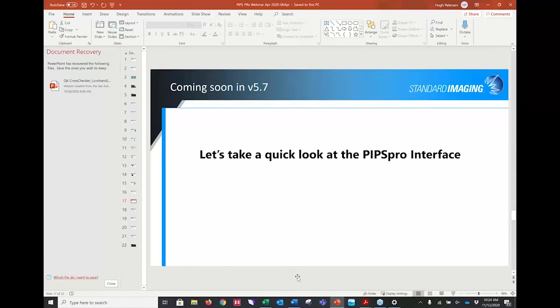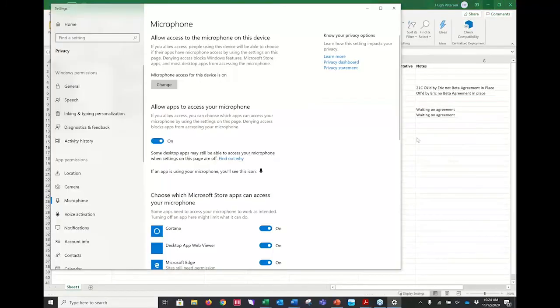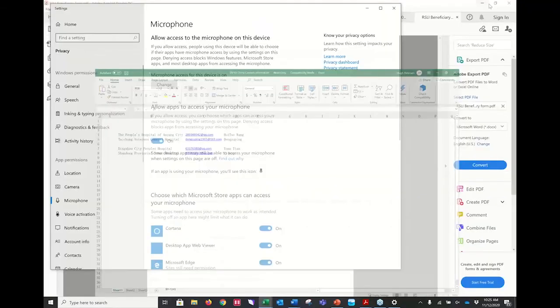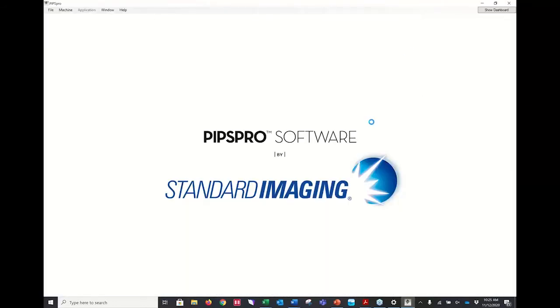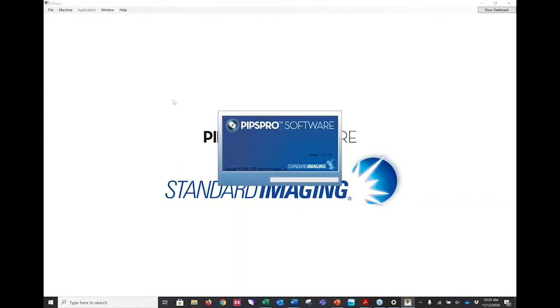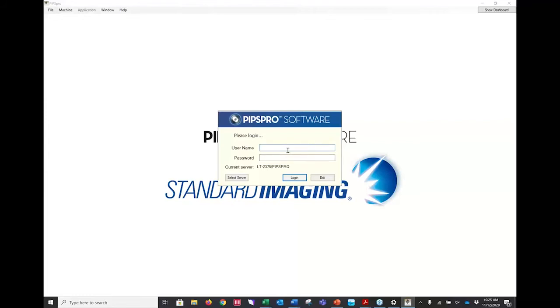Apologies there. Not sure exactly what happened with that. Bear with me one second. This is a beta software for our next release, so it's not quite finished yet.